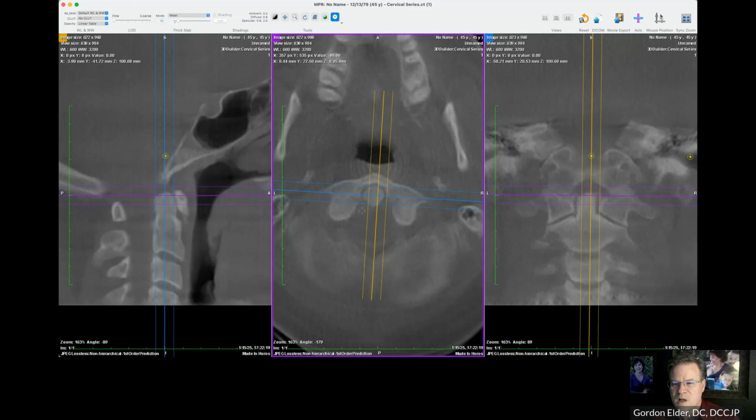All right. And so I've got the field of view over here. The middle field of view is deep enough. You can see here that the whole joint is fitting inside that view on the left side and on the right side. So we need to analyze this joint.